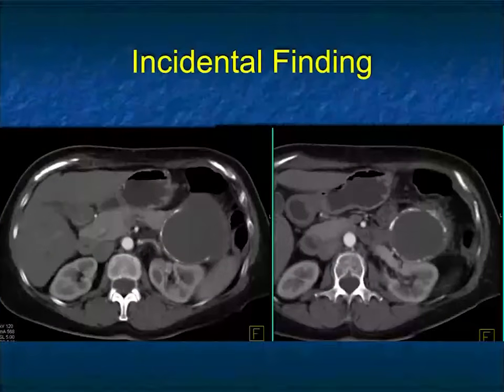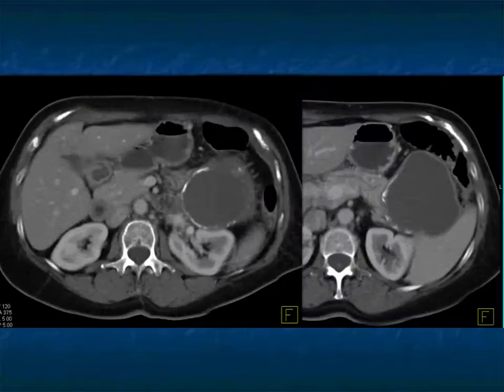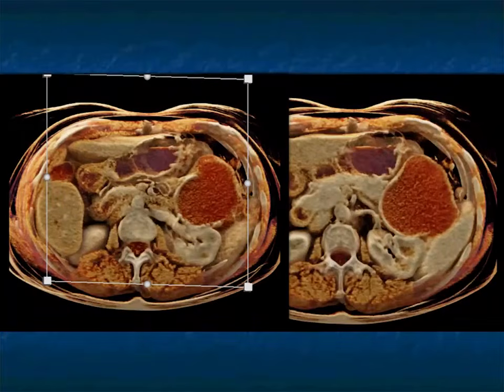Incidental findings, cystic lesion, tail of pancreas, rim enhancement. You can go through a differential from mucinous cystic neoplasms to serous cystadenomas. If the patient was young, you would think about a Spen tumor as well. Could it be old trauma with a hematoma that had rim-like calcification? I guess theoretically that's the case, but there was no history of that. So now I'm dealing with a cystic lesion, rim calcification, nicely shown on the cinematic rendering.